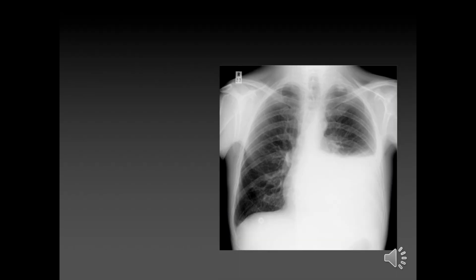Tell what that fluid is. You've got no idea, and it would depend on the clinical information that you get, whether that's blood, whether that's chyle, whether that's just fluid.